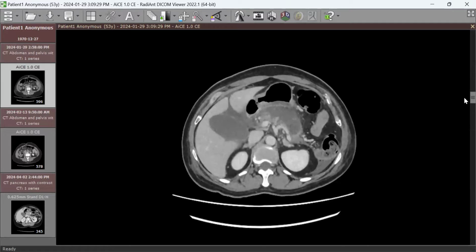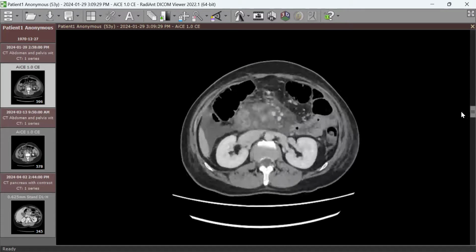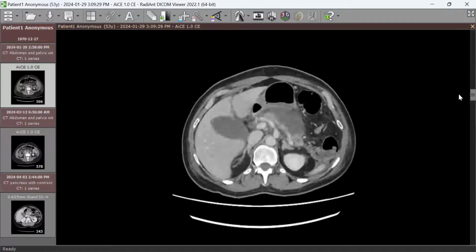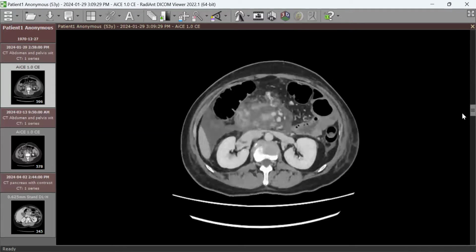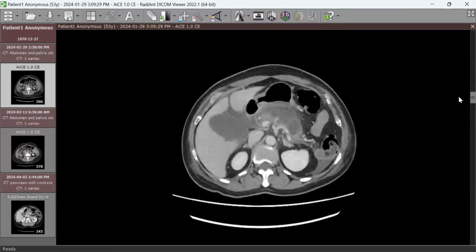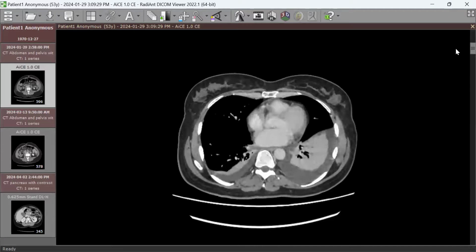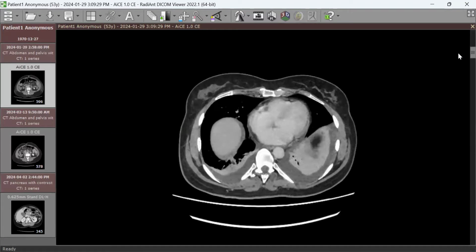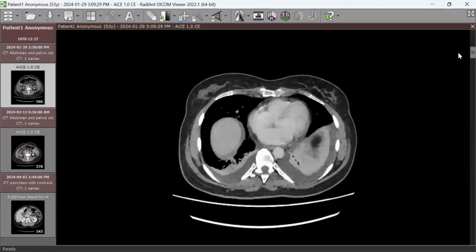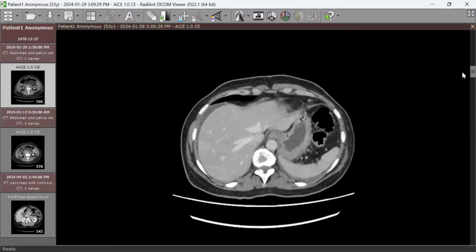It's inflamed, right? Yes. And also thickened down. Yes. Exactly, and also the duodenum, obviously, right? And also we look if there is also a colitis at the same time. So inflammation of the surrounding bowel. And superiorly, as you clearly mentioned, we have pleural effusions, and with consolidation and collapse. Collapse, yes. In both lungs. These are also the complications. So we covered the complications here.